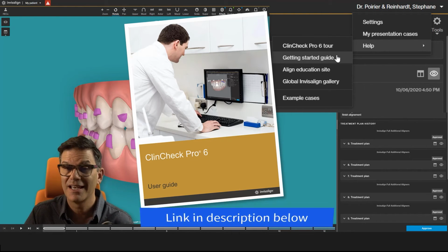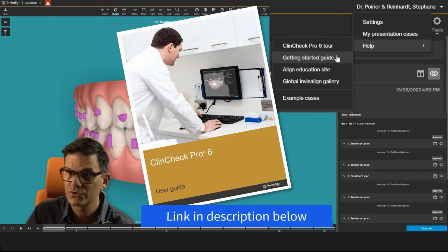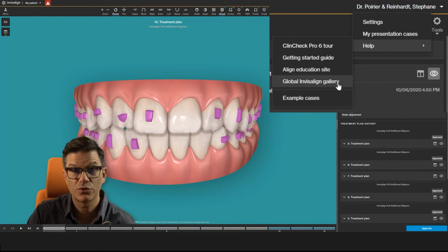You only have to click on it, and it's a PDF file. It explains everything. It explains all the tools at the same time. You have the Align Education site with a lot of courses. Everything is free. I encourage you to go there. There's a lot of good things.